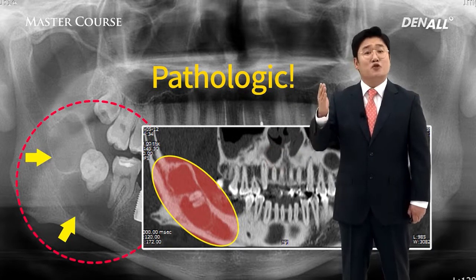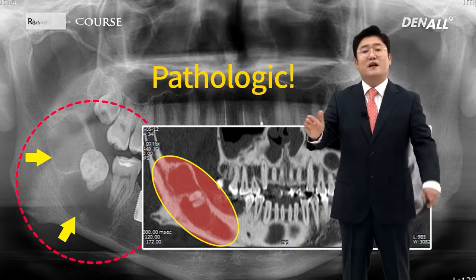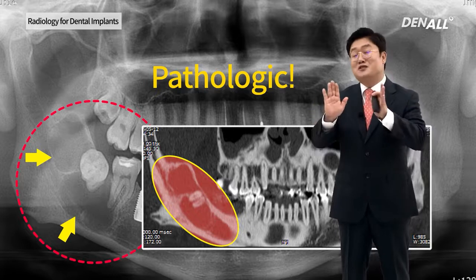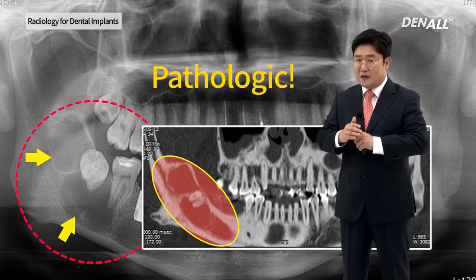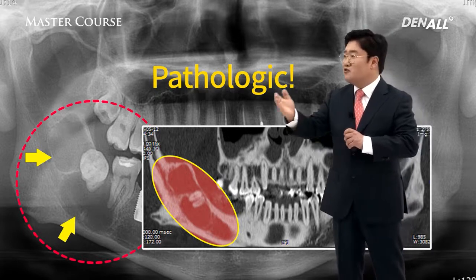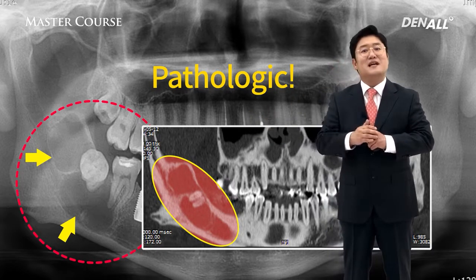Panorama, very important daily procedure. CBCT is around, but still for implant surgery or surgical planning or to check the outcome of the surgery, panorama is very important. If something is off, something unfamiliar structure is observed, we need to remember that we need to suspect that.